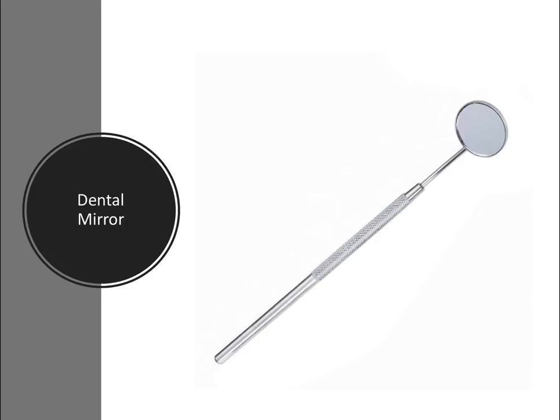We call this ability to look at oral structures using the mirror indirect vision. And you can try indirect vision yourself if you have a wall mirror in your bedroom or your bathroom and a separate hand mirror. You stand with your back to the wall mirror and then hold the hand mirror in front of you, and then try to look at the back of your head, angling and using both mirrors. It can be a little disorienting to track your movements, like if you were brushing your hair in this fashion, for instance, but this is the learned skill of using indirect vision. And really all it takes is some practice.